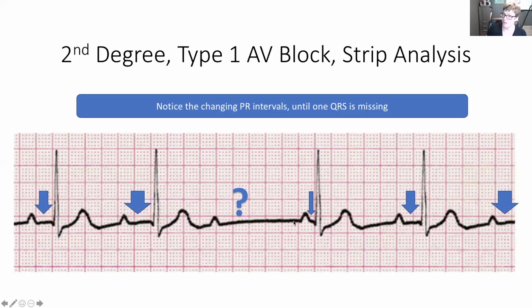And because there's no QRS, there can be no T wave. So then we come to the P. Oh, we're starting all over again. Things are working just fine.